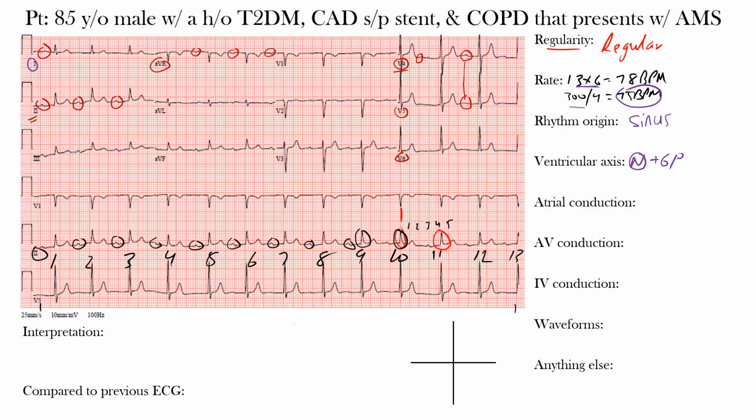So now with the ventricular axis, here is 0 degrees. And this is where lead 1, the positive end, sits. This is positive 90 degrees. Okay, AVF is down here, that positive end. This would be plus or minus 180 degrees. And then we have negative 90 degrees here. And when we talk about normal axis, remember, the physiologic normal axis lies between negative 30 degrees and positive 105 degrees.